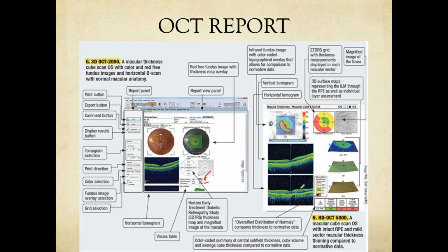But again, depending upon what kind of deposits are there, you classify it further into various other pathologies. In cornea, same thing in the retina, where you see a lesion very, very specific to a single layer, not affecting anything else.